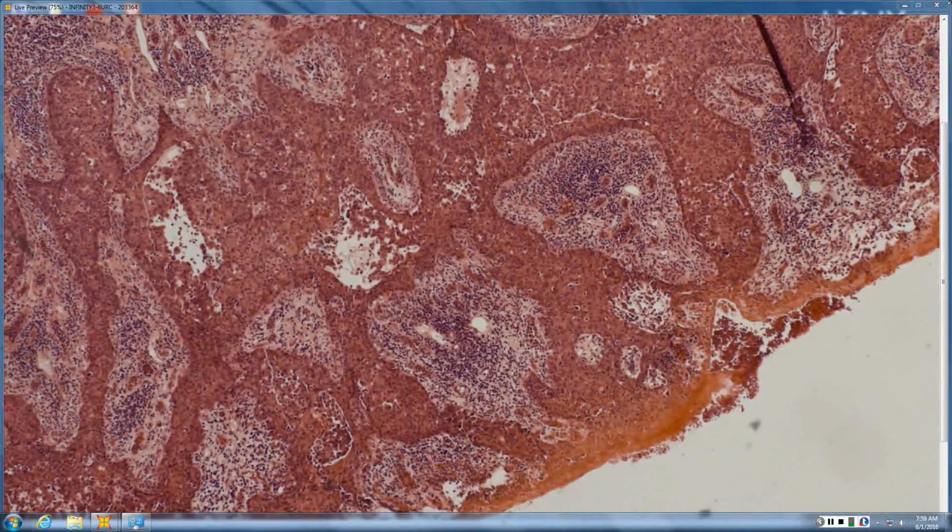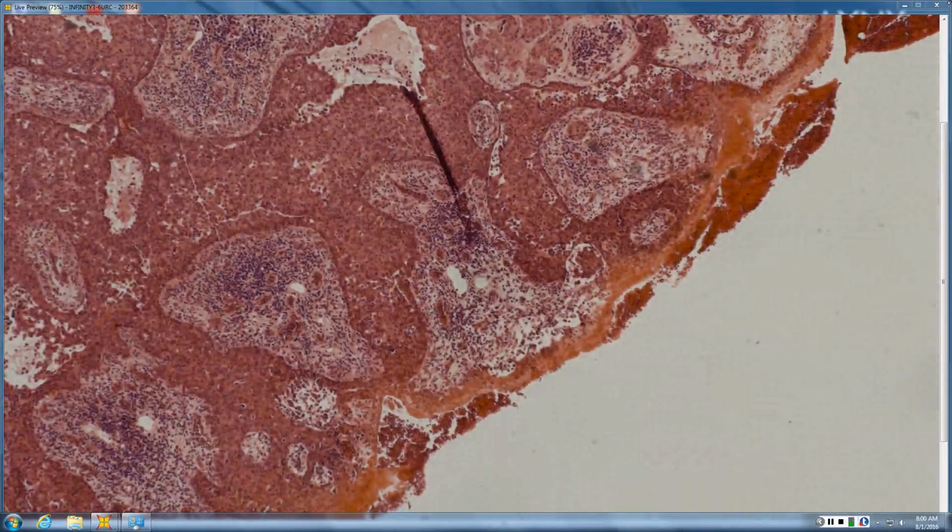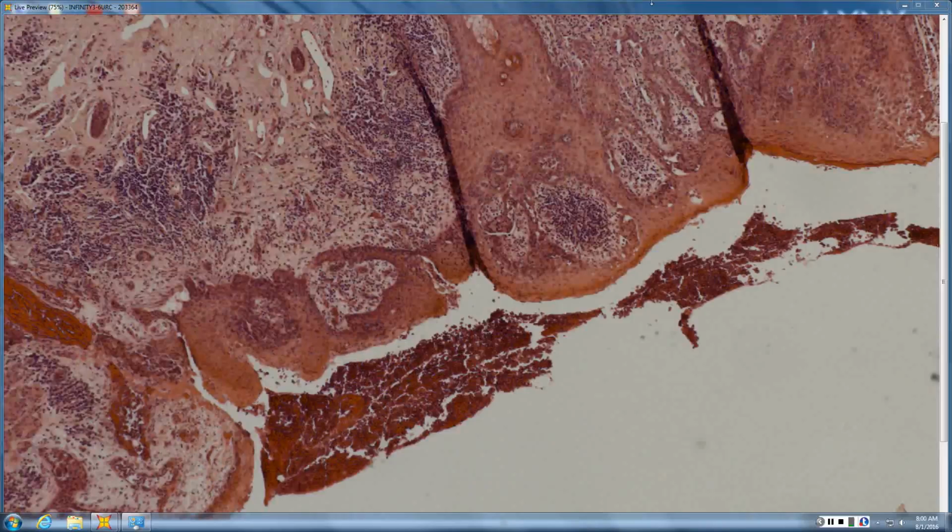There we go. And in this case, you've got a mucoepidermoid salivary type tumor growing with an intraepidermal Paget's pattern. Those we'll commonly get when it's from the tail of the parotid. So the most common place that we see that is retroauricular. So you've got a retroauricular ugly squame. It may actually be a primary salivary tumor. That's a place for mucoepidermoid carcinoma.